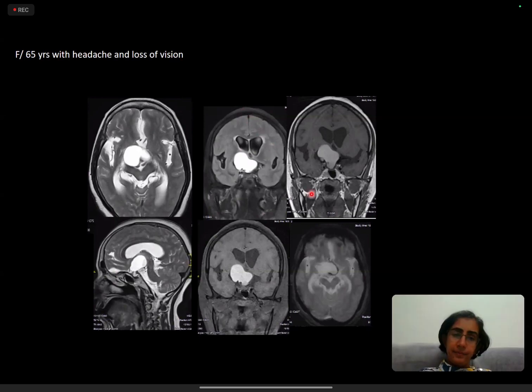That's right. So it is T2 hyperintense on FLAIR as well as T1.